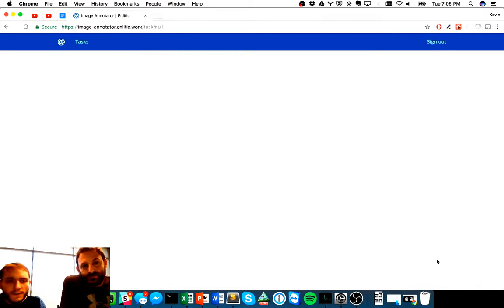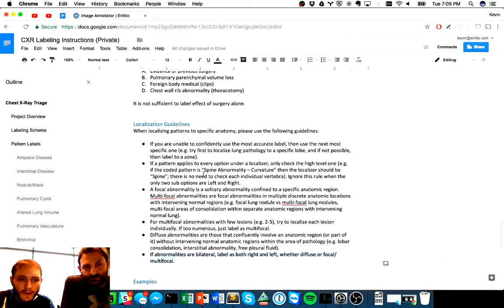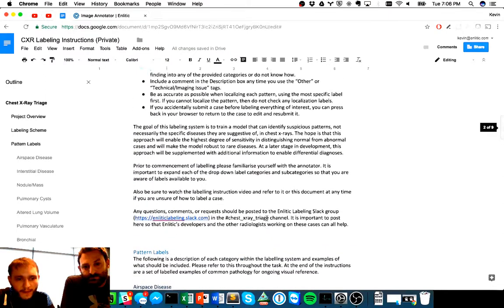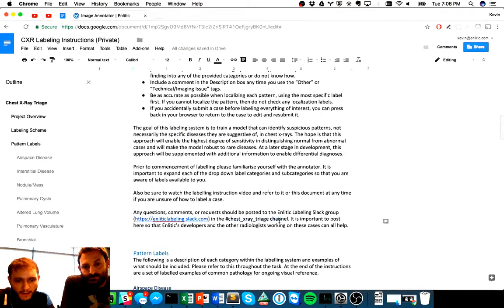Great, so I believe that takes us through all of the examples that we've set forth to show you and walk you through as part of this exercise. As we mentioned before, all of these examples will be included in the instruction document. If you have any further questions that aren't covered as part of this video or the document, please reach out to us on Slack. We'll try to be as quick as possible about fixing any bugs or answering any questions. Try to post all of your questions in the chest x-ray triage channel, which we've outlined right here in the document.